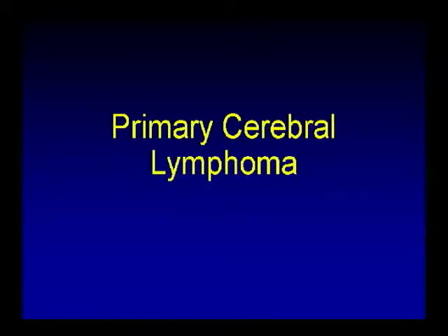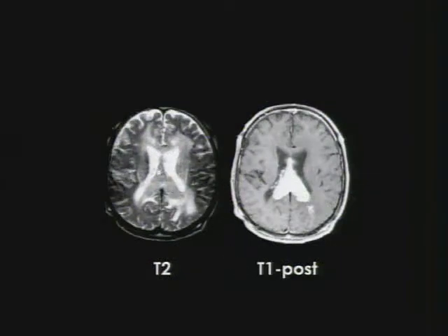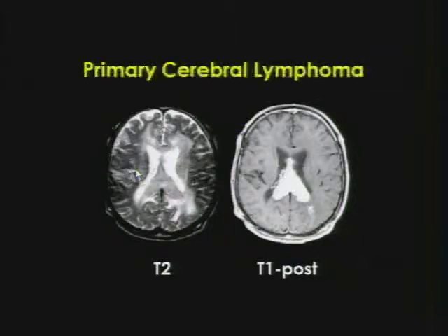Cerebral lymphoma is a very interesting tumor. Nobody can figure out why lymphoma incidence is increasing, but nonetheless, incidence of lymphoma in immunocompetent patients is slowly rising. One of the caveats about lymphoma is that it tends to involve where glioblastomas can involve. For example, corpus callosum is not an uncommon location, but usually the T2 signal characteristic can be helpful. Usually, lymphomas tend to have a fairly homogeneously low signal intensity on T2, and they tend to have mildly reduced diffusion. Look at this case.